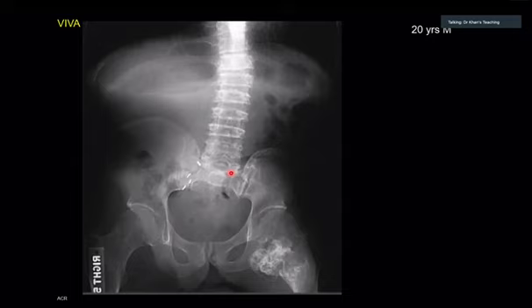Last case of the day is a beautiful case, and I warn you, it has come in the exam. So I am not at all interested here. I know that this is an osteochondroma, so I don't want you to describe it here. Over to you.